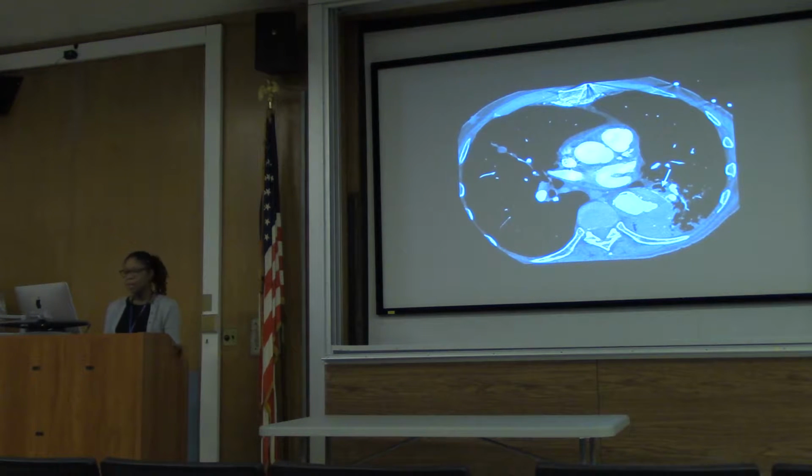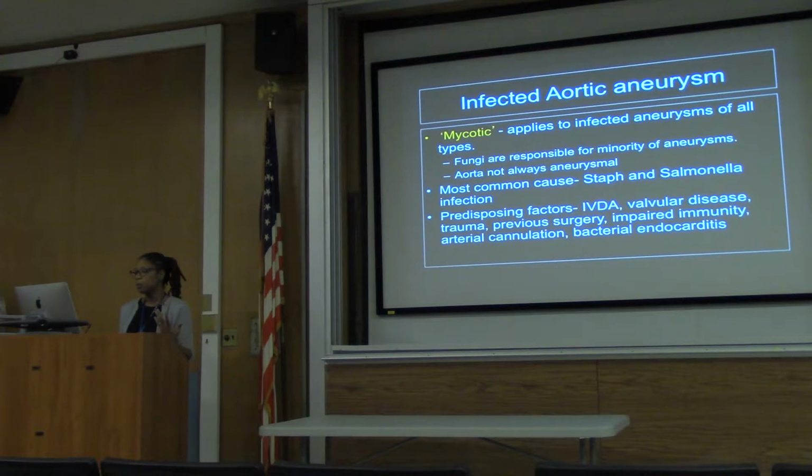I want to spend a little bit, any questions so far? No, okay. I want to spend a little time talking about infected aortic aneurysm, which could be a misnomer because they're not always fungal, and the aorta is not always aneurysmally dilated.